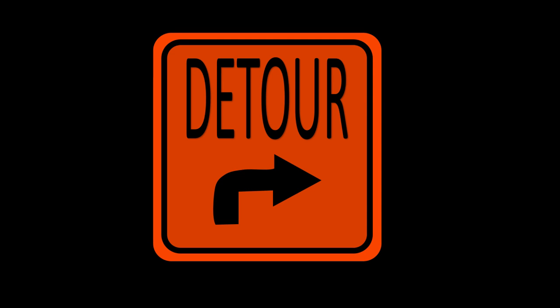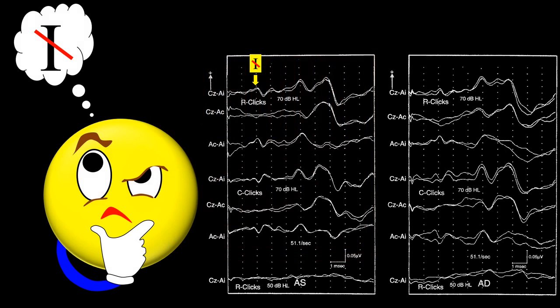Now I want to take a detour. If the first positive wave is not wave 1, what is then the first positive wave in this tracing? Look at the low amplitude used as a reference. This tells you that the overall amplitude of the study is very low. And also notice that there is no stimulus artifact.